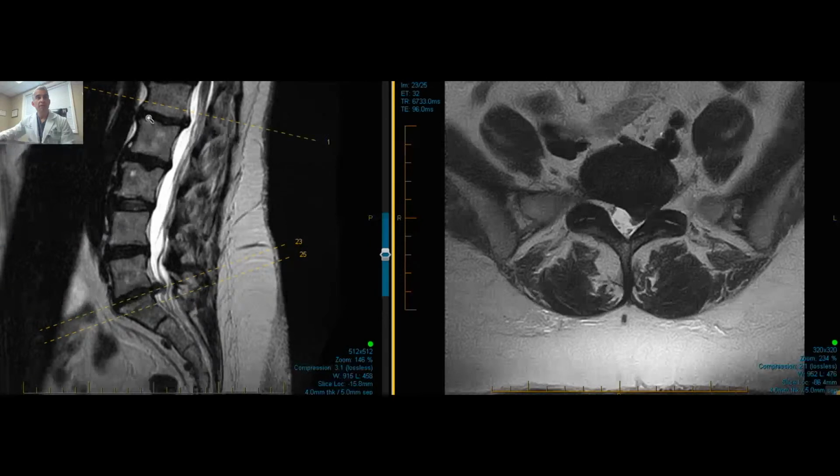As we travel further into this, we'll notice these structures here. Now the white is the spinal fluid. And all these little individual strands you see, and they're about the size of spaghetti, are the individual nerve roots that eventually travel out of the spine and go to the different muscles in your legs. So you have the white, and then you have a whole hunk of strands in here, about a dozen or so in there.